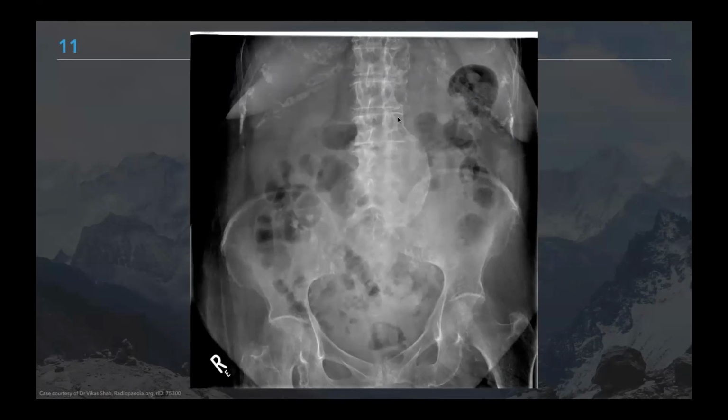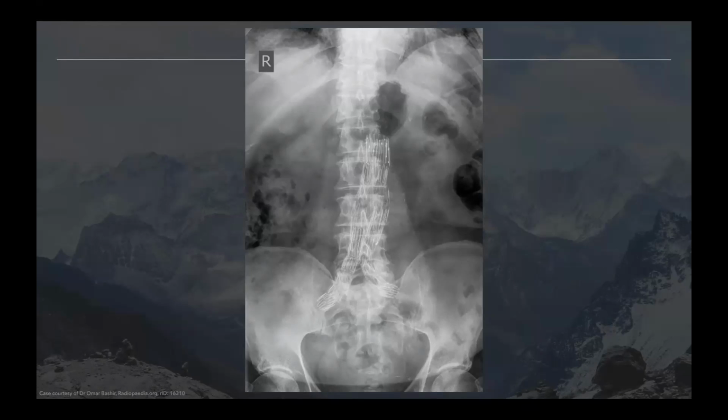And if this is identified for whatever reason, they will then need to go on to have proper imaging, whether that's a duplex or an aortogram. This, I just wanted to throw up so that you've all seen it, is a method of treating abdominal aortic aneurysms. It's called an EVAR, or an endovascular aneurysm repair. And essentially what they do is they put this stent from normal aorta. The aneurysmal segment will be here, so ballooned out there, and the blood will run through the graft and then via the iliac limbs into the common iliac arteries and more distally.